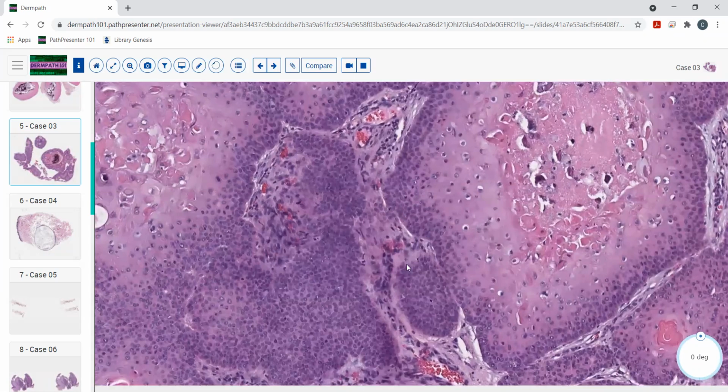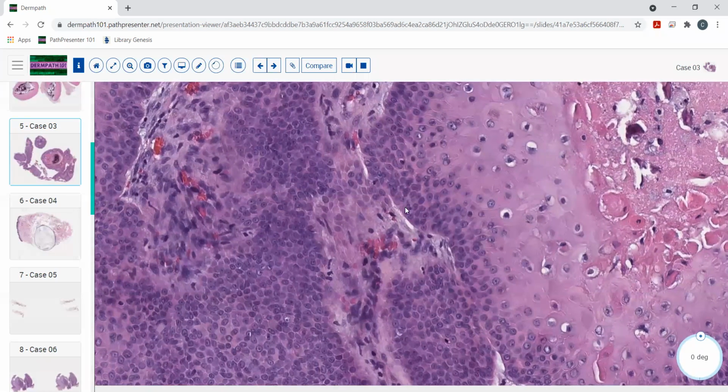And this is a nice example of the outer part of the lower follicle. I'd say it's not really the matrical part of the epithelium, it's really the outer root sheath, inner root sheath, the trichilemmal sheath, if you will.